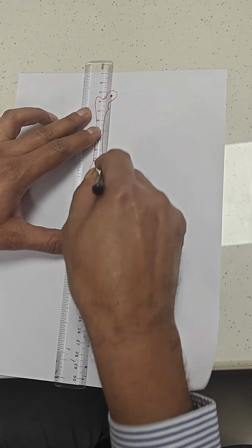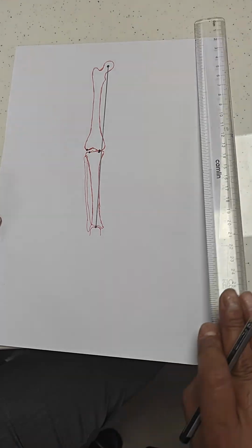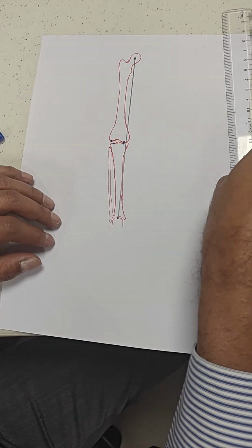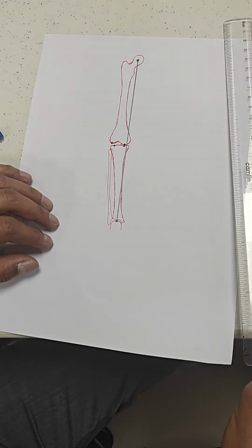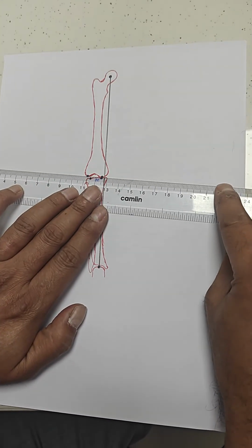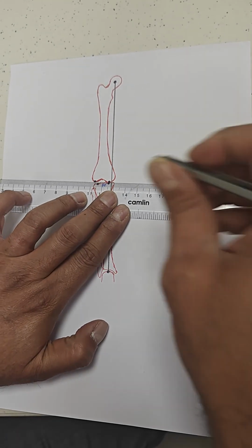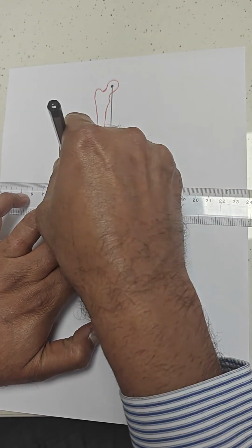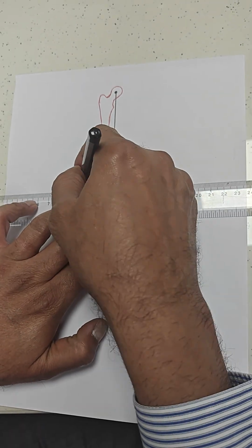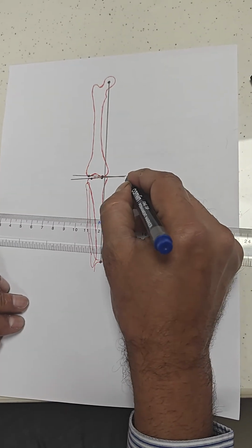So let's say that this is a varus knee which requires an HTO. Now next, we calculate the LDFA and MPTA. We make the axis of the femur. This is the most convex two points of the femur joining, and these are the two concave points of the tibia. So this is the JLCA.